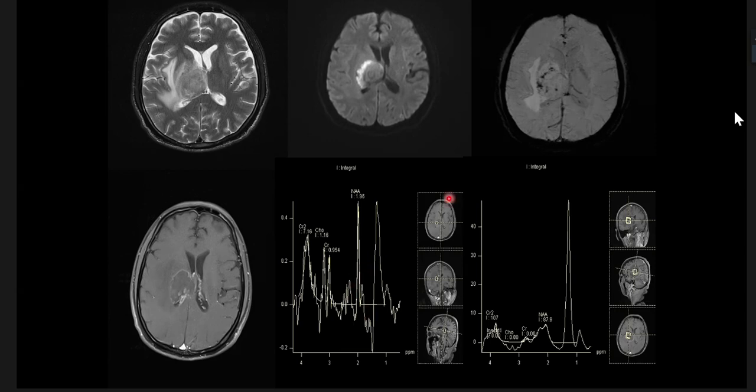Does tuberculosis present with blooming? If there is an associated hemorrhagic component, it can. Caseating tuberculosis will have hemorrhages or it will have necrotic components. So do necrotic areas bloom on SWI images? And if you say there is caseation, it should show restricted diffusion. That is a liquefaction, correct? Yes, sir.